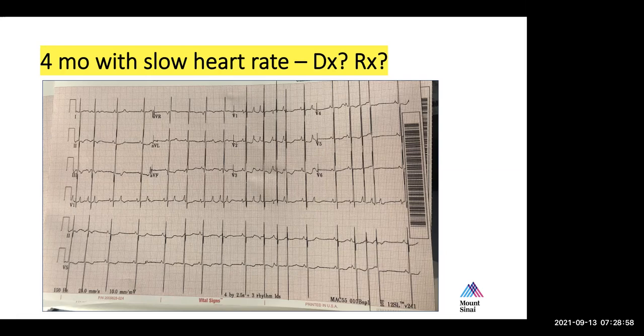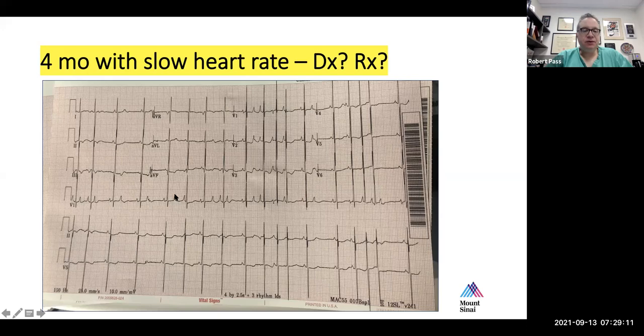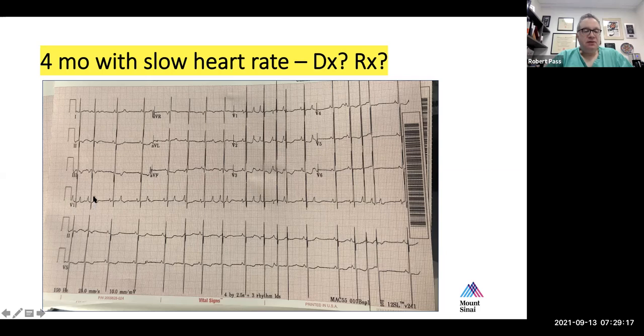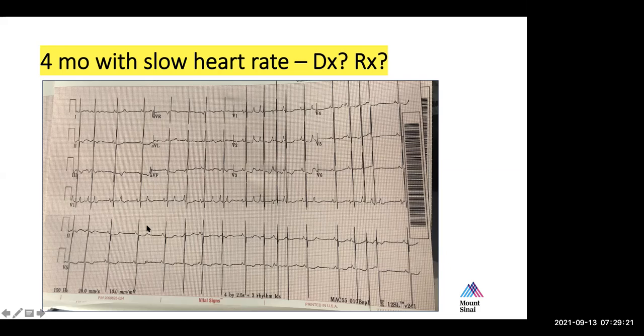This is a 4-month-old, and that P wave came in at a rate of about 150. Which one, this one here, you mean? Yeah, or both the ones that came after. There's one that came in quite a bit faster, right? Even a rate of 300 beats per minute. Yes, so that one I wouldn't expect to conduct even with a healthy AV node.